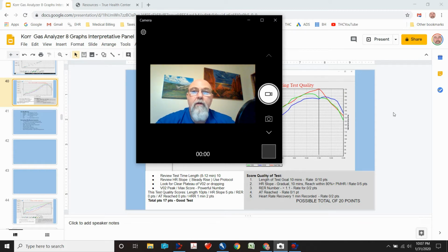I'm also using the videos as a way to help me train and articulate what's going on in each part of the test. This is part 5 on the evaluation of the test to see if we have good test and good data so that we can move on to interpretation. So after this particular video, we will move on to interpretation. So this is part 5, and we're going to look at heart rate recovery. Pretty straightforward, so let's get to it.